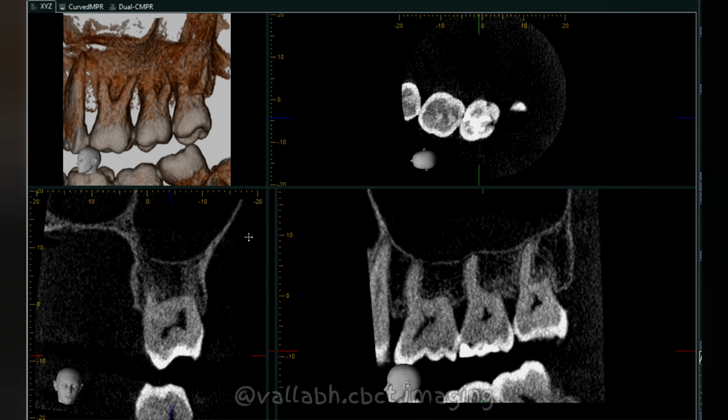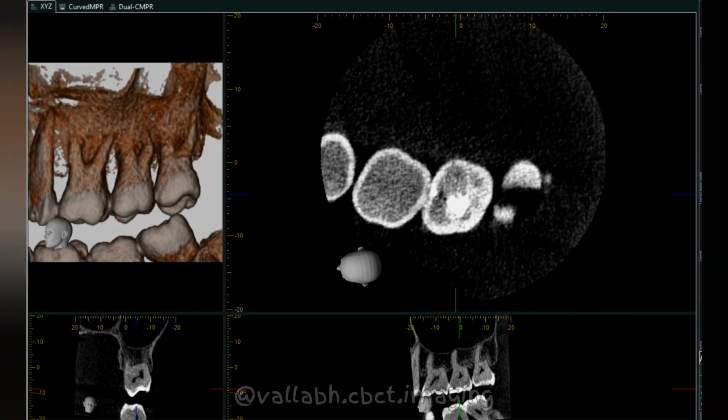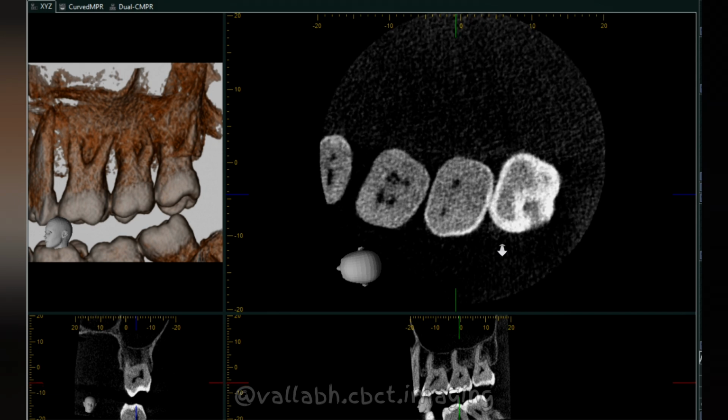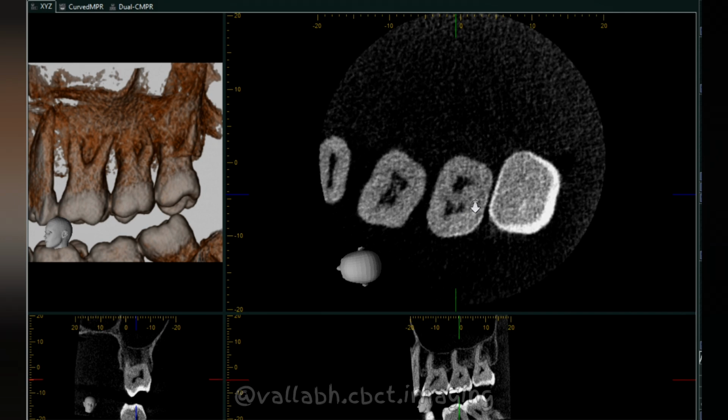Also, when we took it in the axial cross section, as we go from the crown occlusal aspect down, there is a secondary caries over here. I'll just mark this. There is a secondary caries, and then we take it down. As we go down towards the dentinal region, we approach the coronal pulp horn, which is seen.